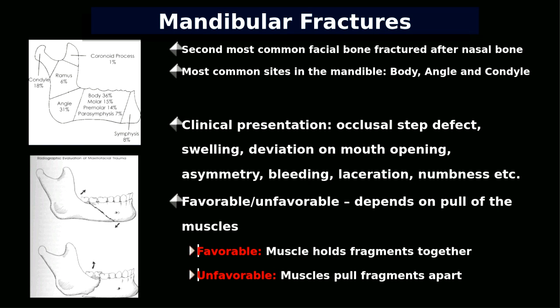One of the oral surgeons I met about 5 years ago, he missed one. A very good friend of mine, so he always advised me, never miss any fracture. It's not good for the reputation, for your practice, and also for your colleagues too, and definitely for the patients. So you can see mandibular fracture is the second most common fracture after the nasal bone fracture, and you can have fracture of the body, angle, and the condyle area.